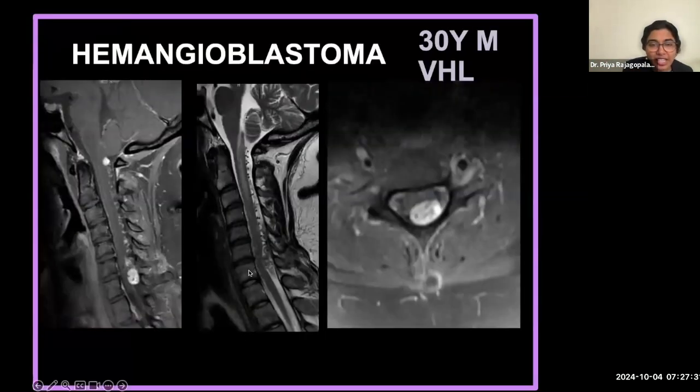So here's a case, right? So this is the tumor. You see how it's along the pia, it's very close to the pia mater, right? Very dorsal in location. And if you notice, look at all the vessels that have come to supply this tumor. It's a very vascular tumor, and look at the amount of vascularity. You see all these collaterals coming to supply this tumor. These vessels are nice and engorged, and you can actually see them in this patient.